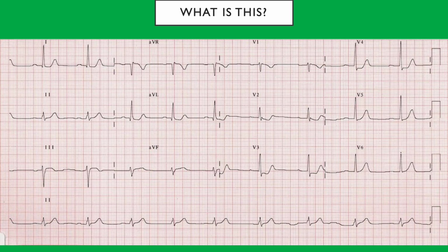What is this one? Where are my ST elevations? V2. Three, AVR. AVR has ST depression.